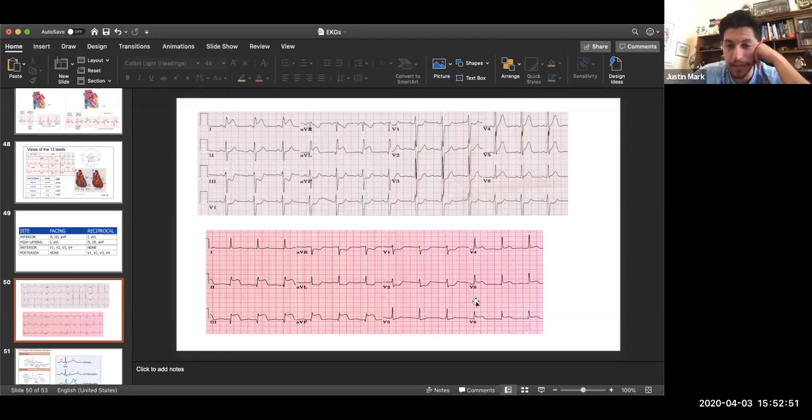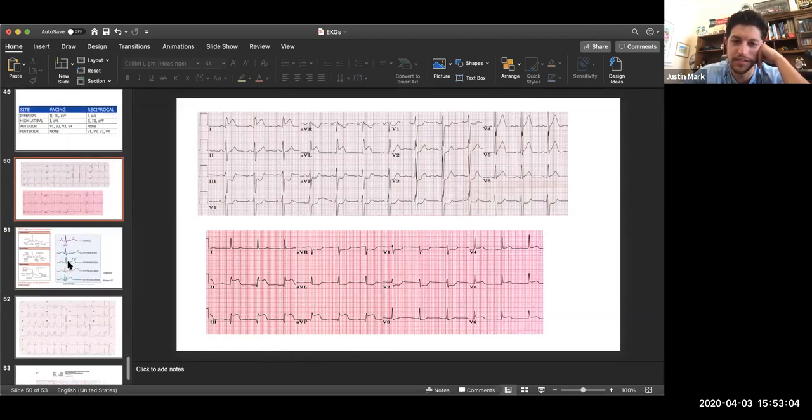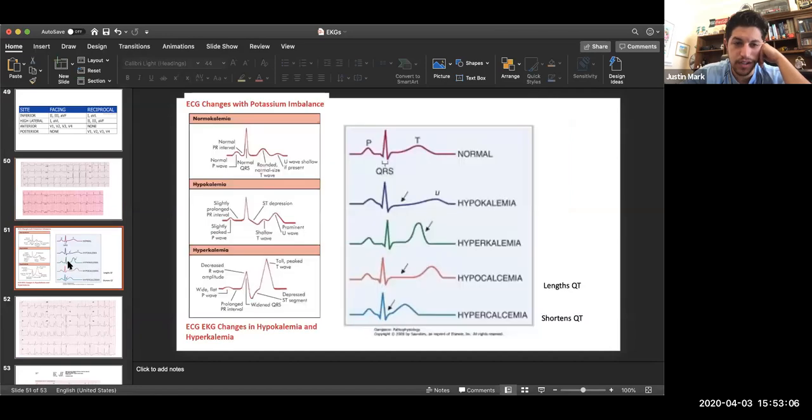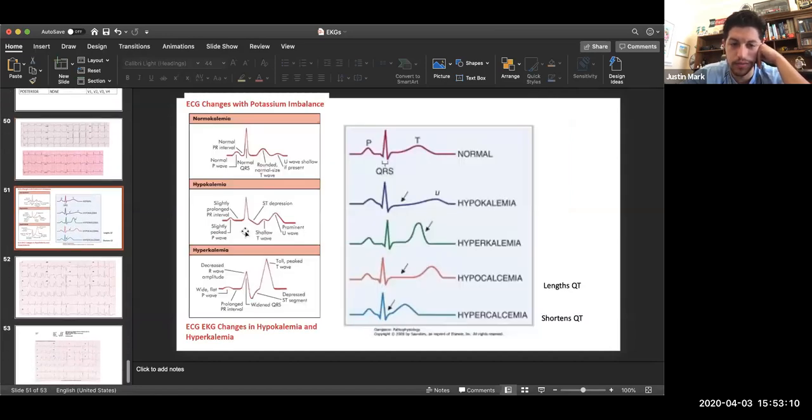Okay. Yeah, I mean, it's possible there's multiple vessels, but this definitely stands out. So that's really what I was getting at here. All right. So I think we're all pretty good at ST elevations. Let's see what else I have. I think this is the last one here in terms of actual concepts. This again is just recognition.